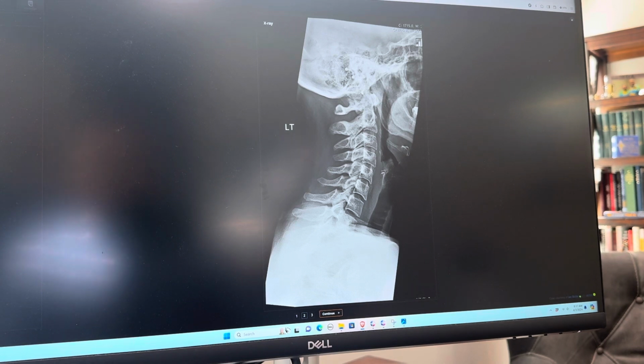And so this is a website, it's called radiopedia.org, and in it, I just typed in lateral cervical neutral, it's an LCN film, and I typed in normal, right? And this is what they have given us for showing us what a normal X-ray should look like. And if you look at my mouse right here, what I want you to appreciate is that our C1, which is where my mouse is following right now, has a really good spacing between the base of the skull and the second cervical vertebrae. You can see it has a pretty solid angulation going on there.